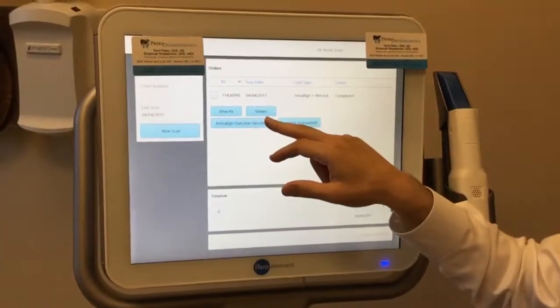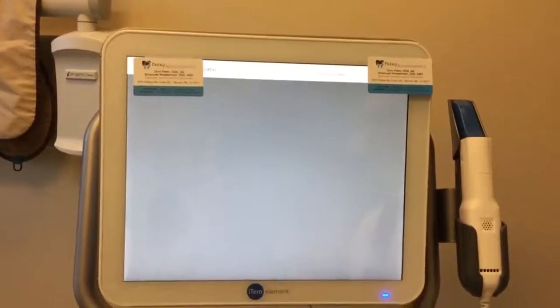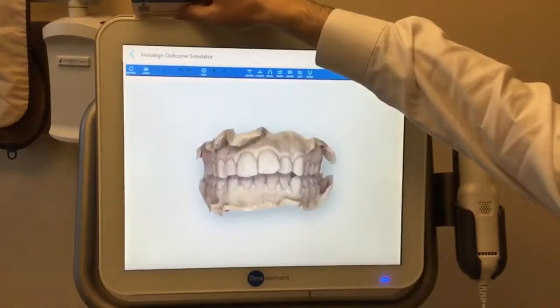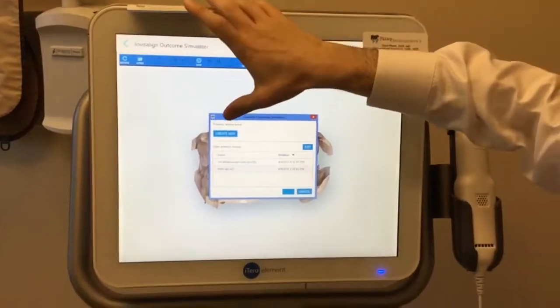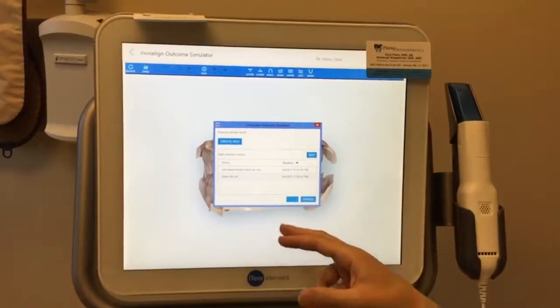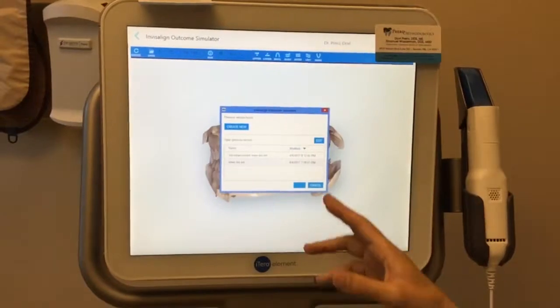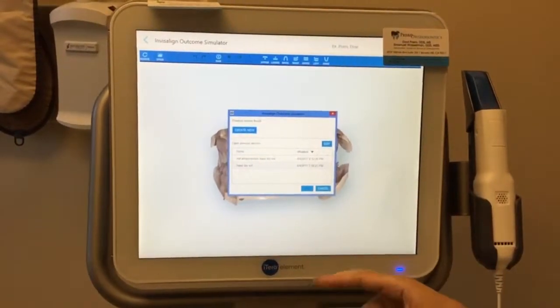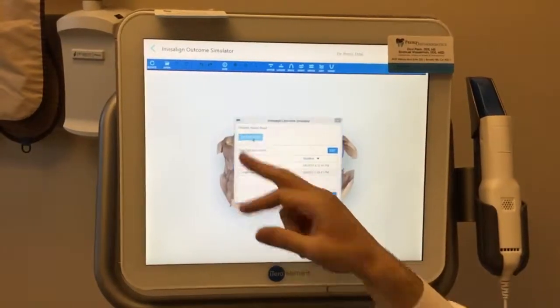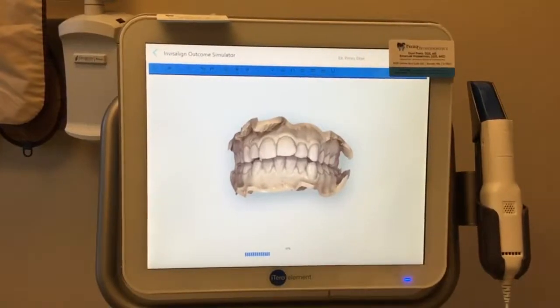So we brought up the patient. This is for our third simulation. Now we mentioned before about being able to pull up previous versions. If you've saved one before, then you'll be queued to add. The system will ask you if you want to bring up a new one. For now, we're just going to create another one because I want to bring you guys through the whole process.